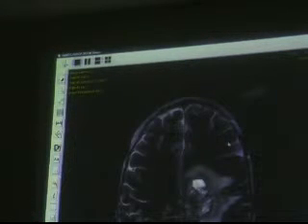So here I ask the system to download the images of the patient, and at the end of the process I will have a control button appearing, view, for instance, in that case. In that case it loads the image in a proper viewer. So you can do this at the level of the image, of a series of images, or studies, and so on.